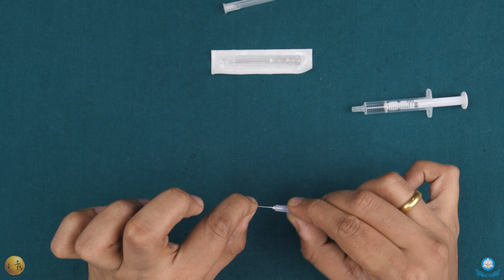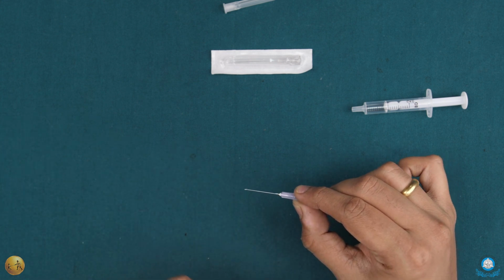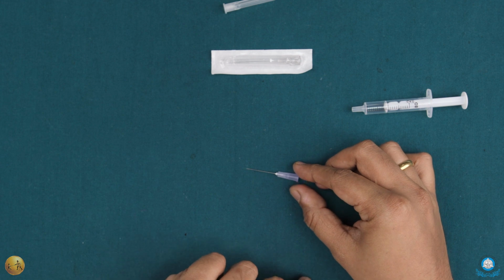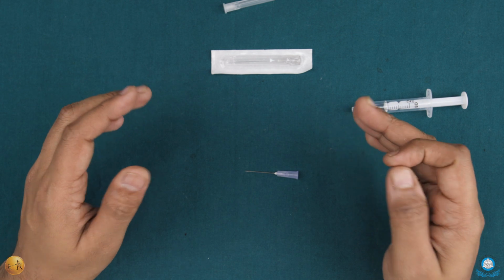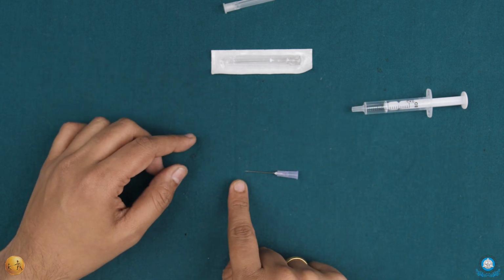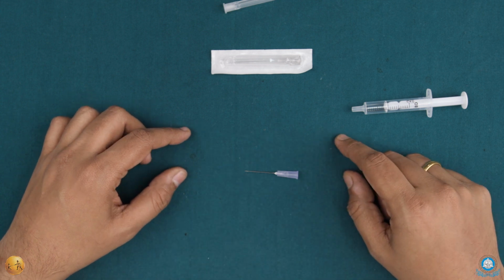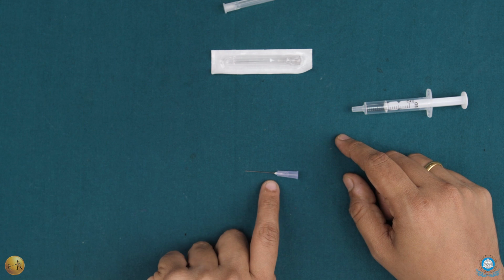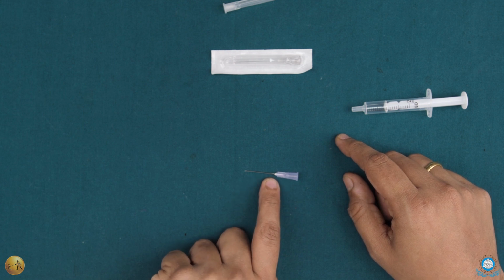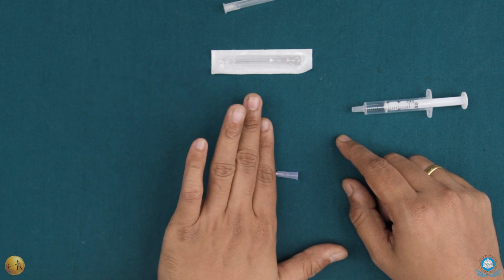It remains stiff. And because of that, this forms a point of anatomical weakness. In other words, when you are injecting, you have to ensure that the entire length of the needle is not inserted into the tissue, because in case you do that, you end up having a separation. The needle is going to separate at the hub and the entire needle is going to be inside the patient's soft tissue as such.